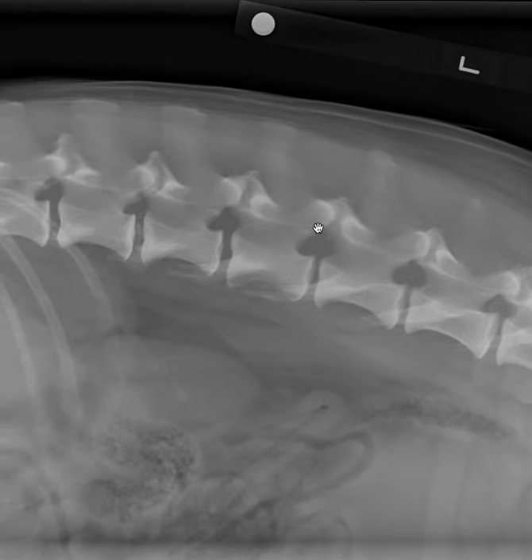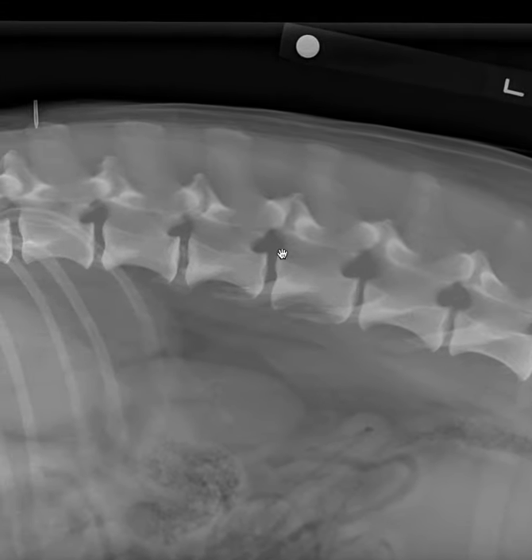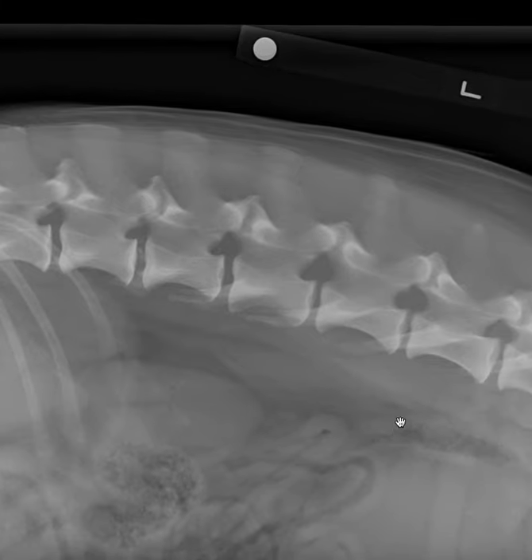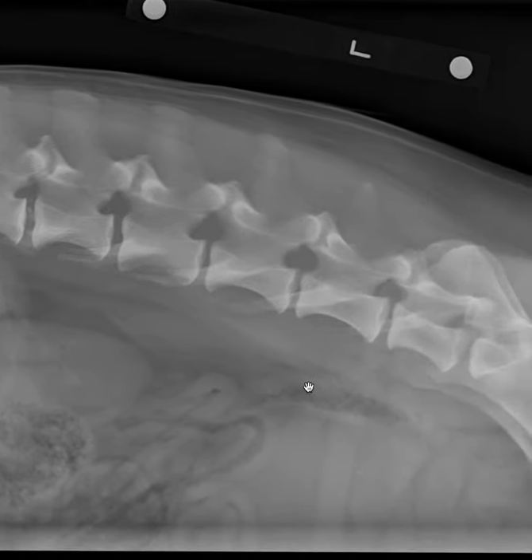Often people refer to it as having a horse head or a Snoopy sort of head type shape. And you can see that we assess those all the way along the entire spine. The individual opacity of each vertebral bone is also something that I pay attention to.